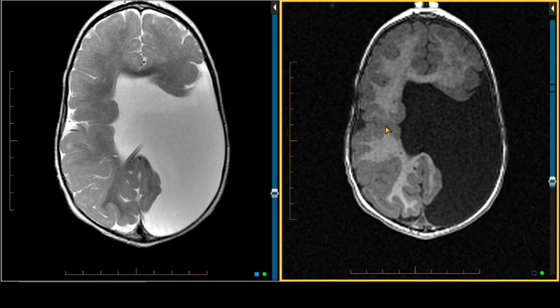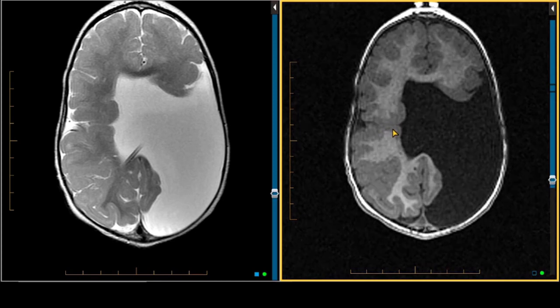Now, this also brings about the challenges in pediatric imaging, where due to their small size and due to some movement, even sometimes if they're getting sedated, it can be difficult to get pristine images like you see in a textbook on every single case. But you don't need it. You don't need to prolong sedation in a child to get an image for a textbook, as long as you can make a diagnosis. So if you know what you're looking for, if you make your diagnosis, all you need is images that can help you make your diagnosis.